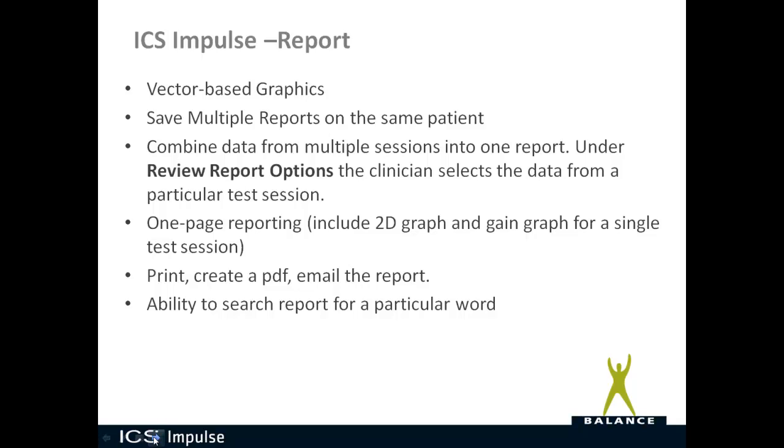You can also easily print your data from the one test session on one-page reporting, including a 2D graph and the gain from the single test session. You can print a report, create a PDF of a report, and email a report, and you have the ability to search the report for a particular word.